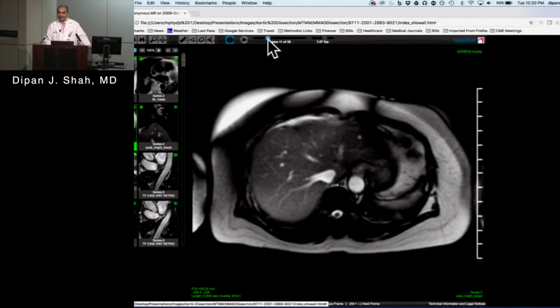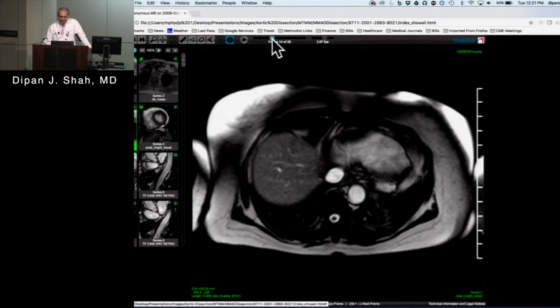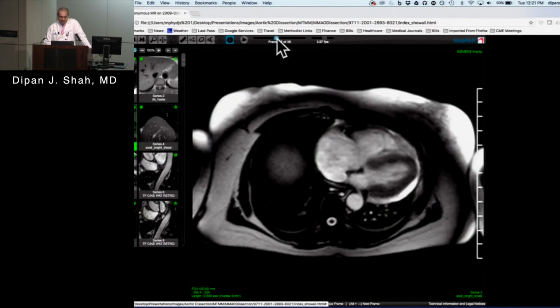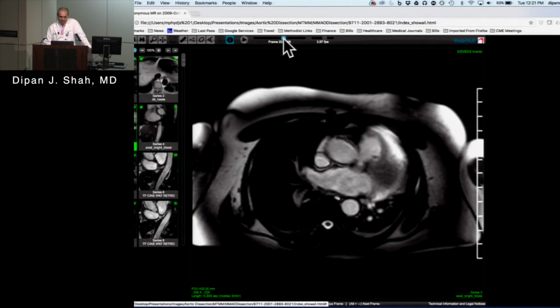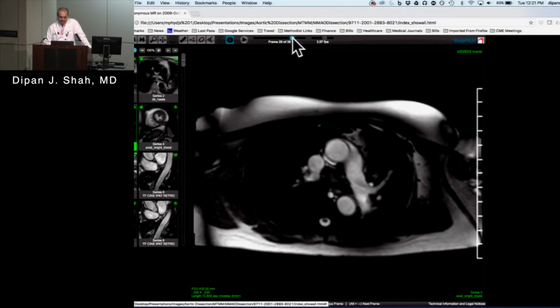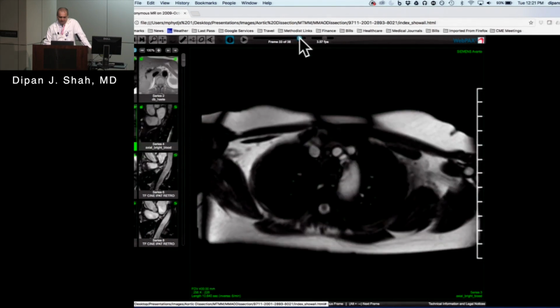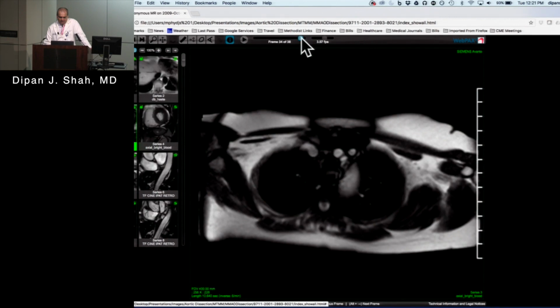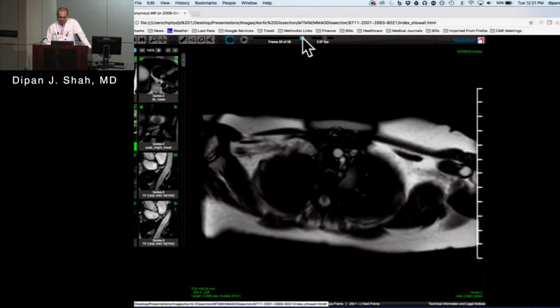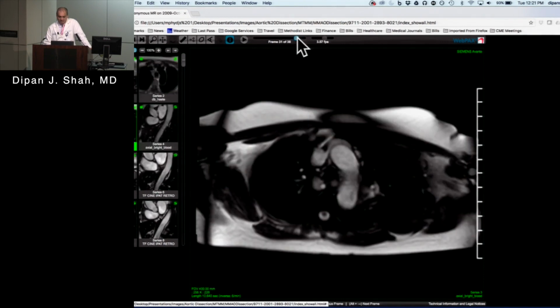And again, these are just straight axial acquisitions. And these are about 5 millimeter thick slices with no gap. And I'll just go from the abdomen up. And you can just take a look at these. And what do you see? Looks like what?